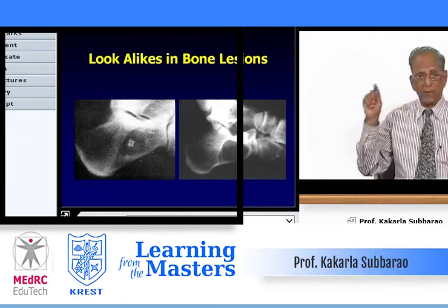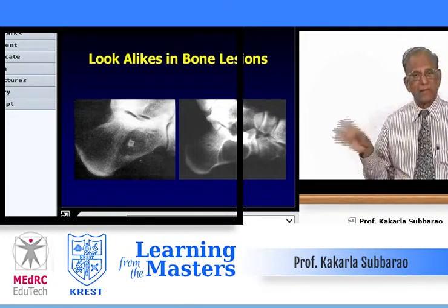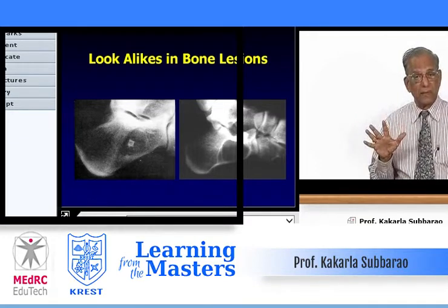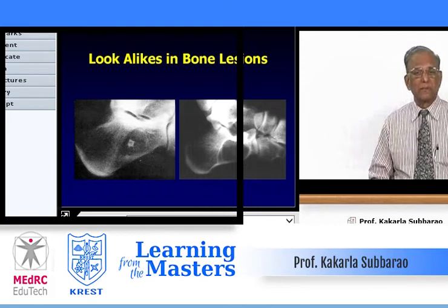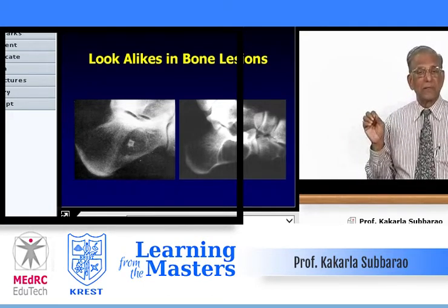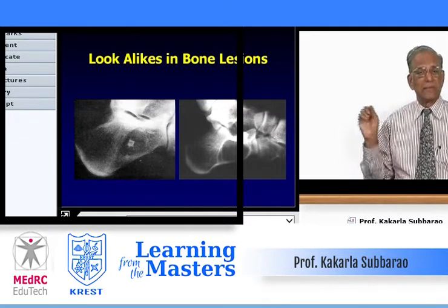Calcification in a large lucent area. It is classical. Whenever you see such a film, particularly in the calcaneum, it is a lipoma of the calcaneum. Because of the liquefaction of the fat necrosis, you may get saponification of fat and then calcification in the center.